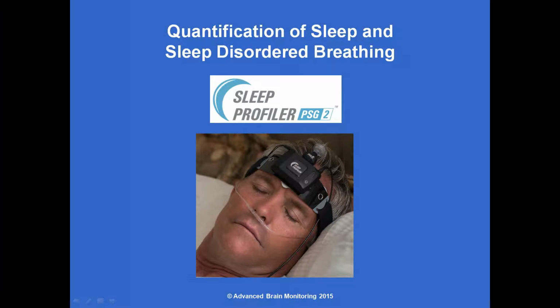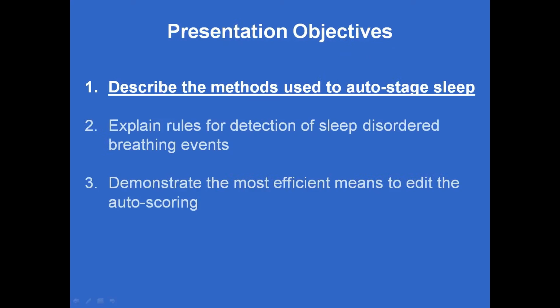Welcome to this introductory video on the quantification of sleep and sleep disorder breathing with Sleep Profiler PSG2. In this first segment, the methods used to autostage sleep will be explained.